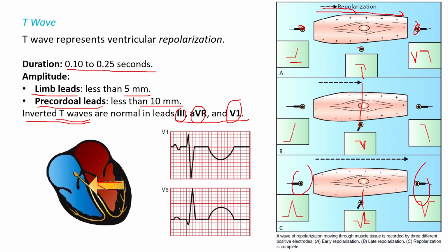It's not the same as depolarization, be careful, it's different. That's why if lead 3 is looking at the heart in this direction, plus 120, this lead is almost getting closer to lead 3. That's why it's normal to see biphasic or negative T waves in lead 3.